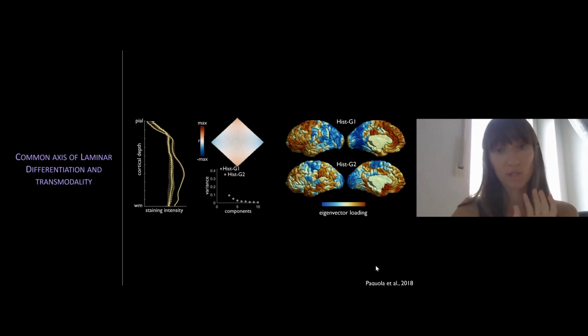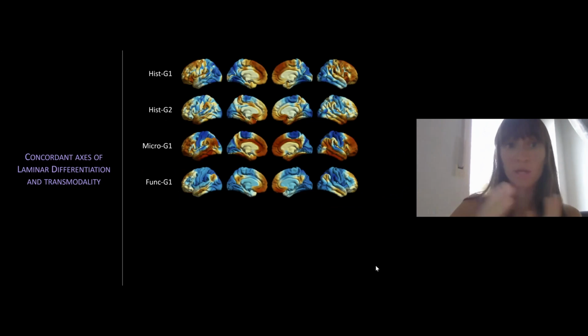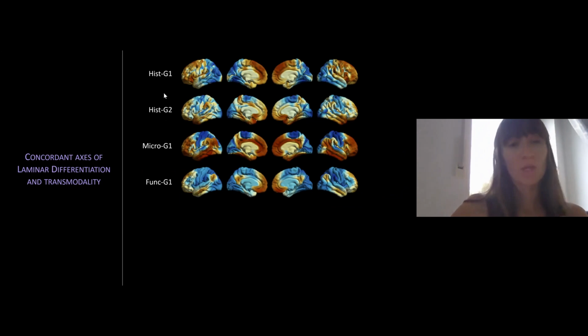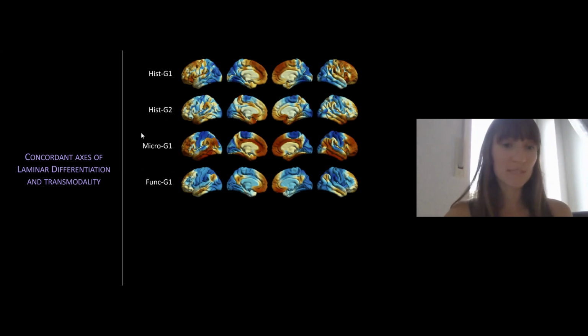So these are projected onto the BigBrain surface. But then what we can do is transform these onto a standard neuroimaging template like fsaverage. And that's what BigBrainWarp really helps us do. It's a lot about doing these transformations. So here we see these histological gradients projected onto fsaverage, which most people in neuroimaging have used at some point in time. And that's also a standard surface that we can use for in vivo imaging.